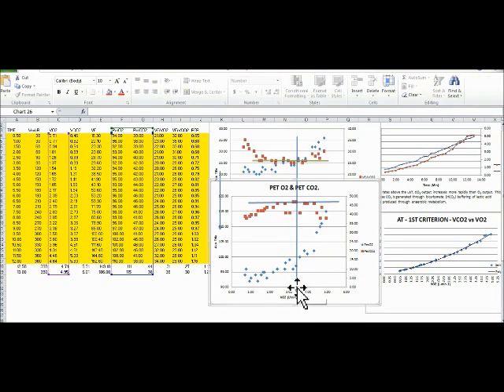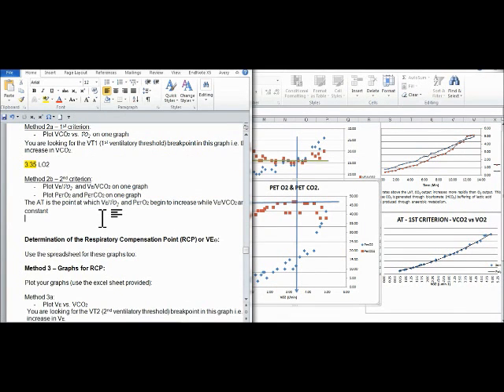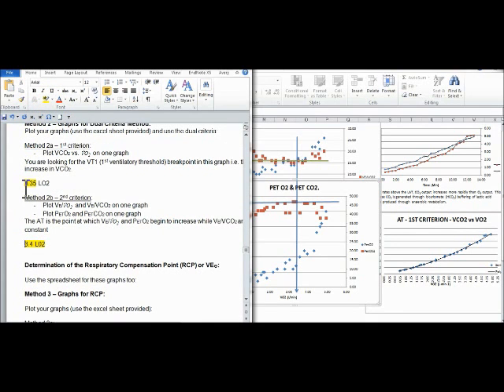Let's look, that's a little bit under 3.5, so let's say 3.4 or so. Okay, so we'll go back to our Word document, and under here we will put 3.4, and that's liters of O2. Okay, 3.4, which matches up pretty nicely with our criterion 1 method.